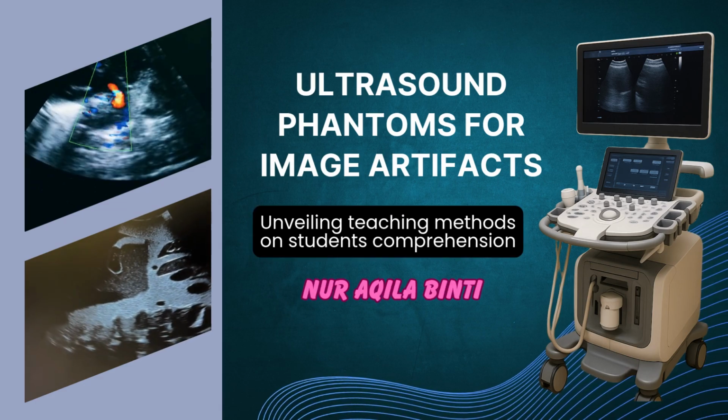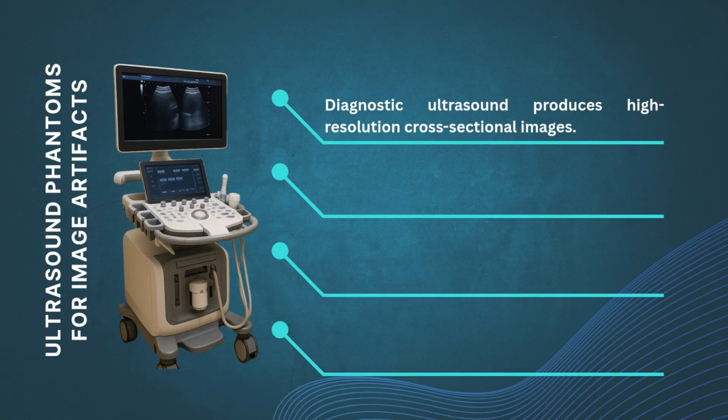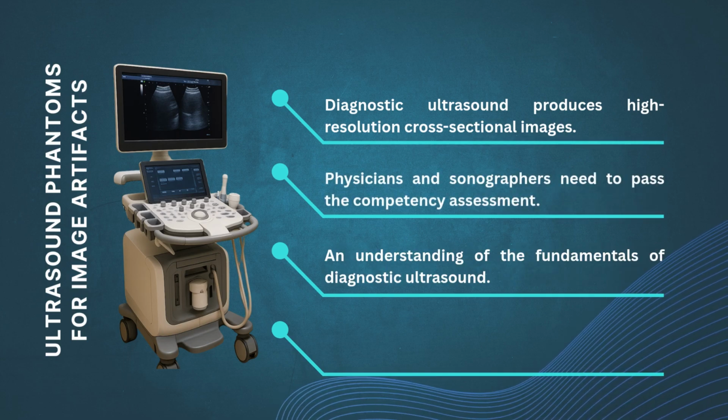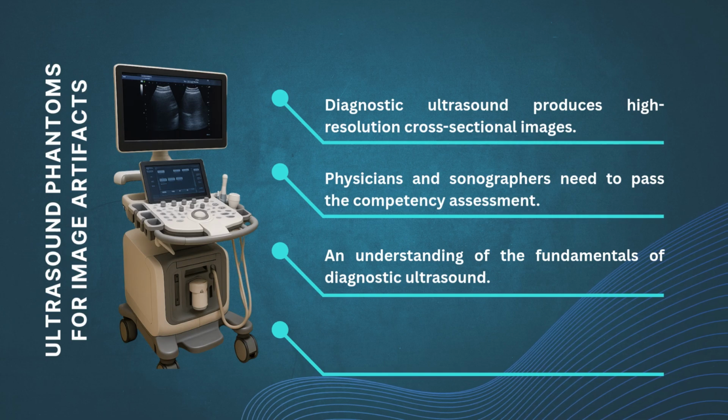Ultrasound phantoms for image artifacts. Diagnostic ultrasound produces high-resolution cross-sectional images of organs, tissues, and blood flow by sending high-frequency sound waves into the body. Physicians and sonographers who need to pass the competency assessment should have an understanding of the fundamentals of diagnostic ultrasound.